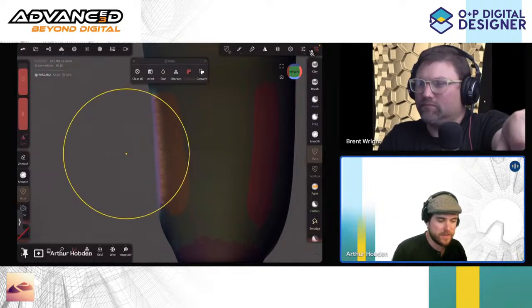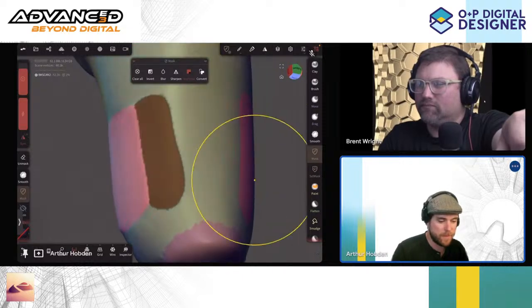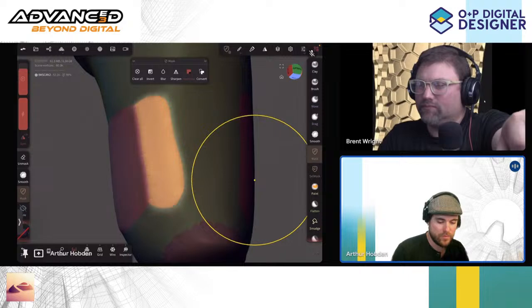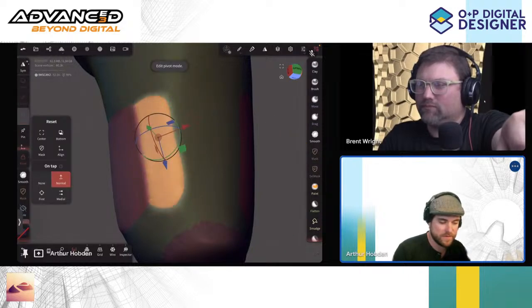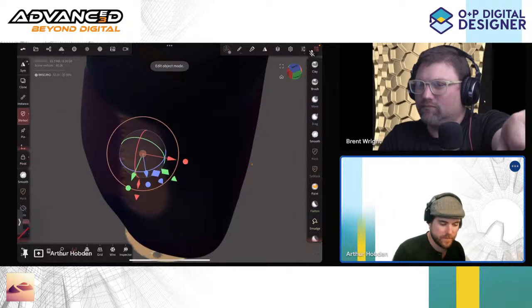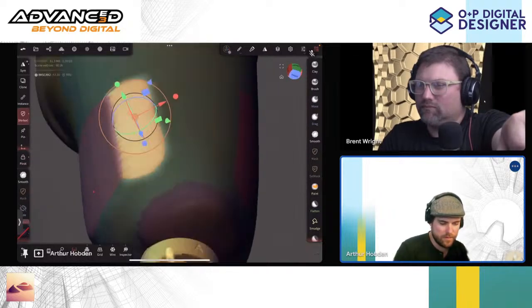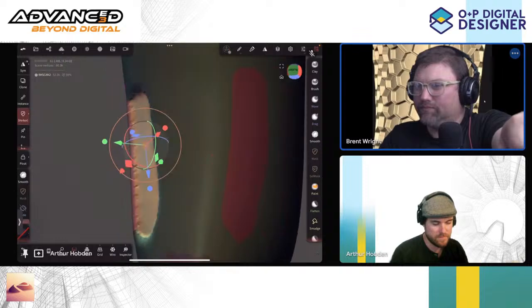So we'll clear our mask, go to the next group. This one was a reload, right? We're going to go in. Yep. Okay, so invert. We're going to move. This one probably does need to be aligned to the normal of the surface. So if we want to move in from here, it'll just be sort of a drop in. Yeah. All right.